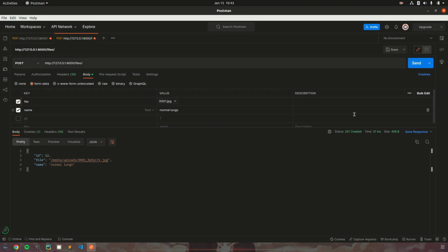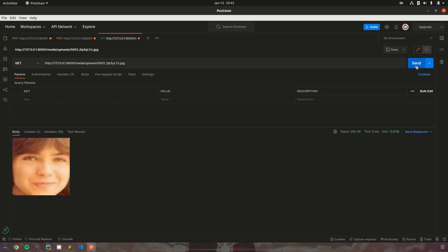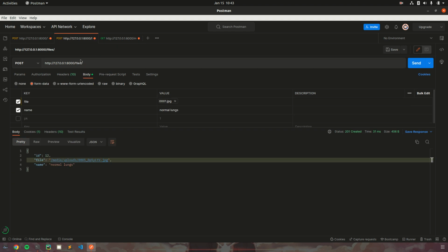If you send this sort of image, it will be stored in the database. It still will be stored in the database. That's not the problem, but the problem will actually arise when you start trying to get results of that particular image.